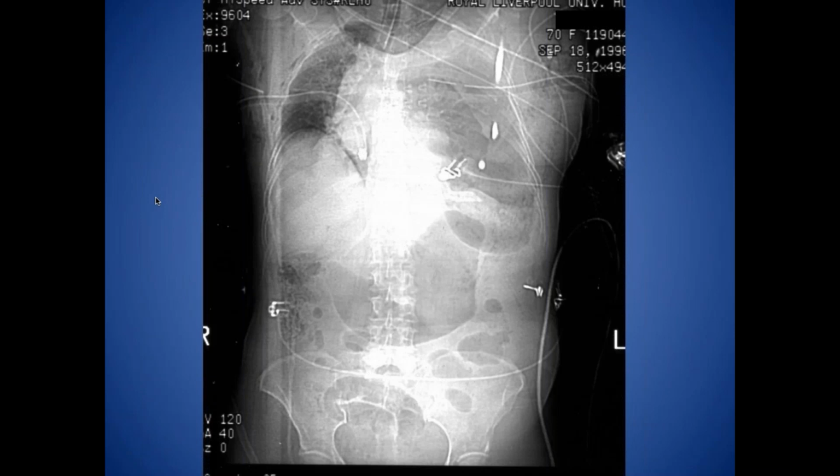Again, there's a ground glass appearance to the left hemithorax, because it's not just a pneumothorax, but it's a hemopneumothorax. And the depression of the diaphragm means it's under tension. And this was the first time in my career that I'd ever done this, but I put a green needle in the second intercostal space, mid-clavicular line, and this hissing note came out of the green needle. So it was a real baptism of fire for me when I was a senior reg on call.